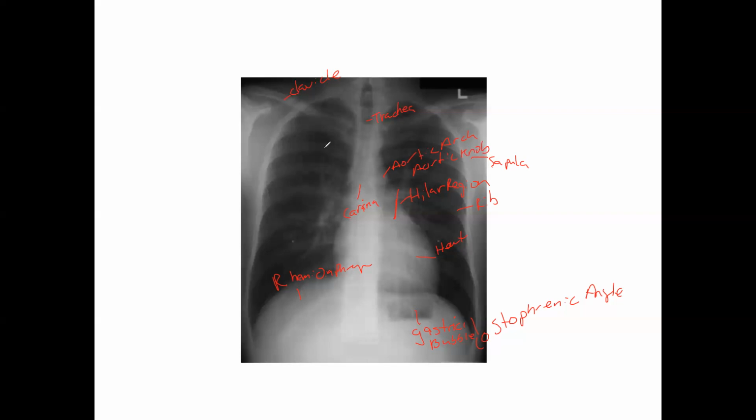And then obviously, if you've got anything different, whether it be a pneumothorax, atelectasis, consolidation, we should be able to see that, any increase in opacity. You probably have some pulmonary nodules that could show up, especially if you've got a patient that might be being evaluated for lung cancer or anything to that effect. Definitely be able to pick out your airways and so forth, and your lines. Another thing I didn't mention just yet, we got the radiopaque line on an endotracheal tube, but sometimes you'll see a tube that comes down and it goes to the stomach. That would be your nasogastric tube or your orogastric tube. So an NG or an OG tube, those have a radiopaque line on them too.